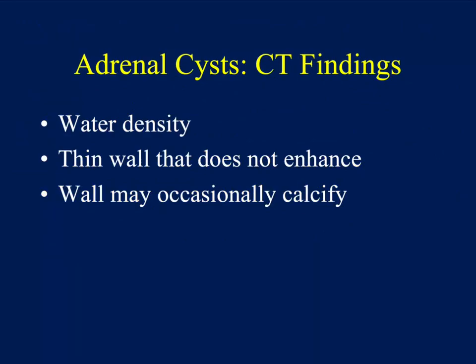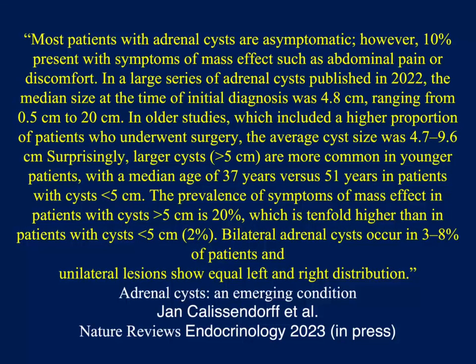So let's look at some lesions very specifically. Adrenal cysts. Typically it's easy. Water density, thin wall may be seen but does not enhance and occasionally can calcify. In this article, in press, most patients with adrenal cysts are asymptomatic. However, 10% present with symptoms of mass effect, such as abdominal pain and discomfort. So it's very important to recognize that you can have symptoms even from benign lesions, and we know that.